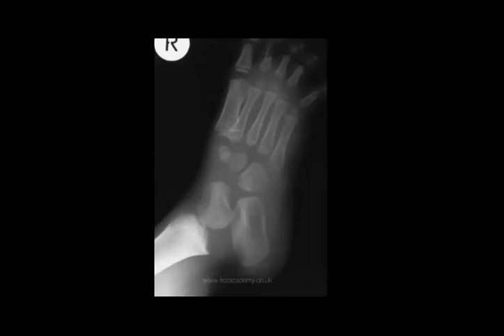Is it a difficult one? I trust in everyone. So choose your checklist. Try to recognize it.